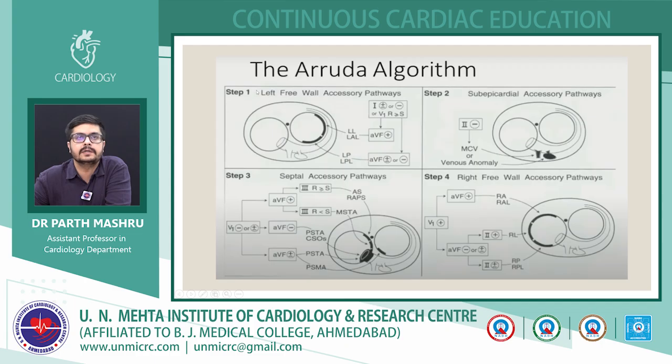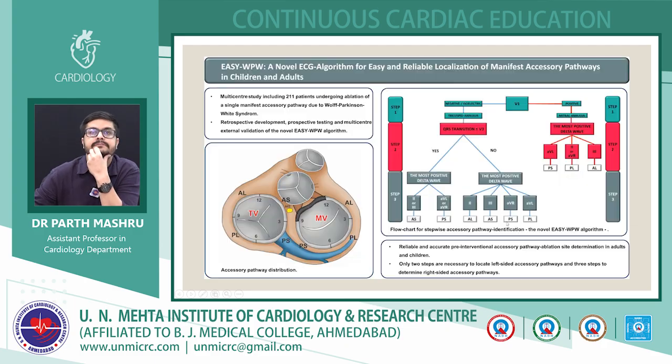We will see step by step application of the Arruda algorithm in the further ECG examples. The important thing to remember about this algorithm is that you have to go systematically from step 1 to step 2 to step 3 and to step 4. You cannot jump to step 4 directly or step 3 directly. You have to apply and rule out the previous locations to move to the next location.